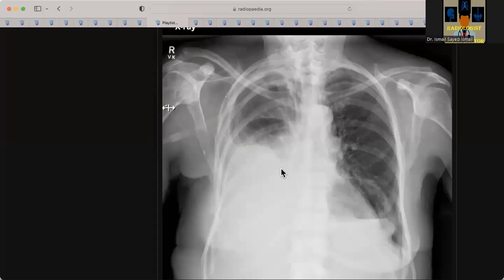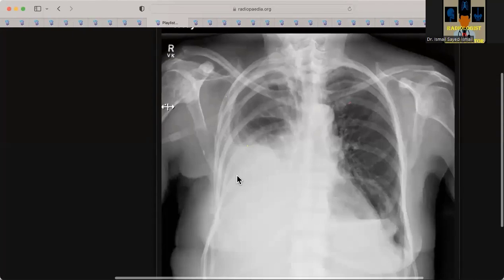Yes, first of all, I cannot see the right hemidiaphragm clearly, with a change of the opacity. It could be due to the right hilar lesion. However, I can ask for windowing of the study to see if there is any hidden mass within the right lower lung zone. Can you see something else? Are there any other clues here?